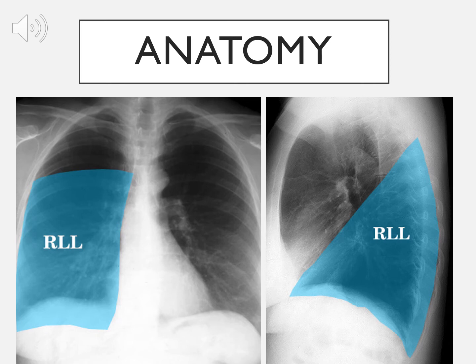I know some of this seems boring and redundant, but what I really want you to take out of this is to look at these images as we're going through this lung anatomy and lobe anatomy. We tend to forget that the lung isn't just transected by horizontal lines and the lobes are cubes. They're really different and not what we would think.